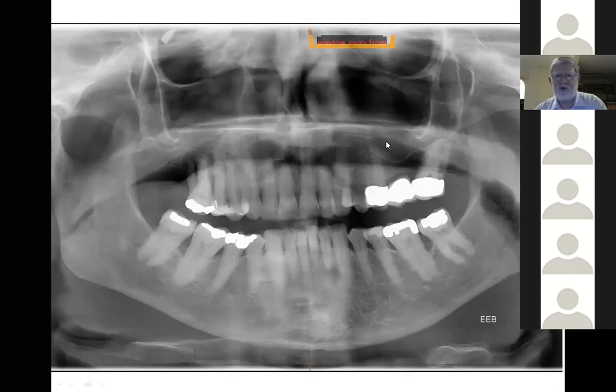Okay, two problems from two disciplines in dentistry here with this patient, looking at the OPG. If somebody can come in there. So getting an endo-perio lesion on the 1-6. Fine. That's fine. Something else, one more? One more issue, sorry.